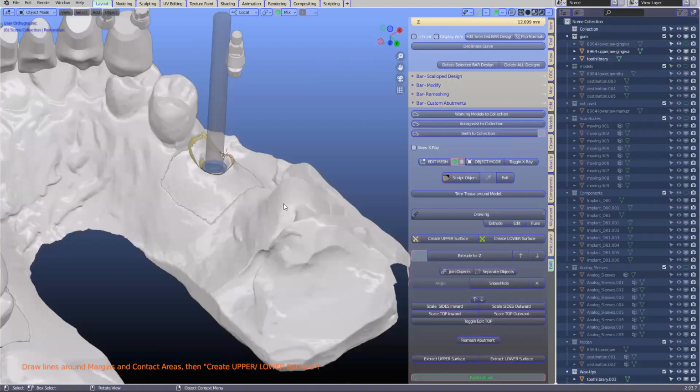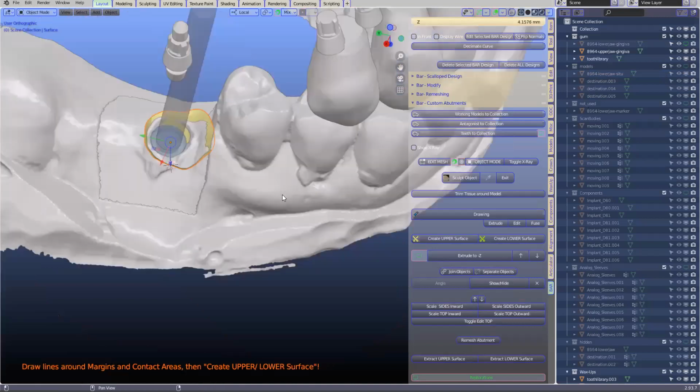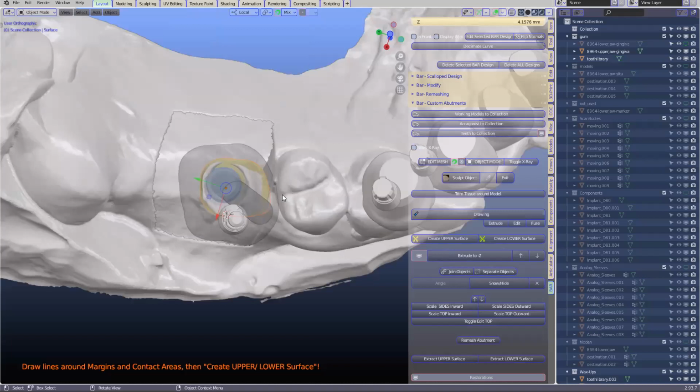So I'm changing my view. Okay, just hold on, look at it from the top. There's a bit of an internet lag here. Unfortunately, I don't know why. So you're just pivoting the scan to view it from the top. Okay, that's where we are now.